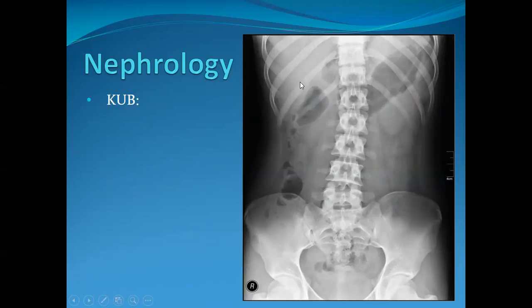What you want to do is look for calcifications overlying the kidneys, which potentially could be renal calcifications. Then you also want to look for calcifications along the tips of the transverse process, and you can see your iliopsoas shadow here. On this side, that's the path of your normal ureter, which goes right along the tips of the transverse process along the iliopsoas. It'll take a little bend where it goes over the pelvis, then come back around and go into the base of the bladder.